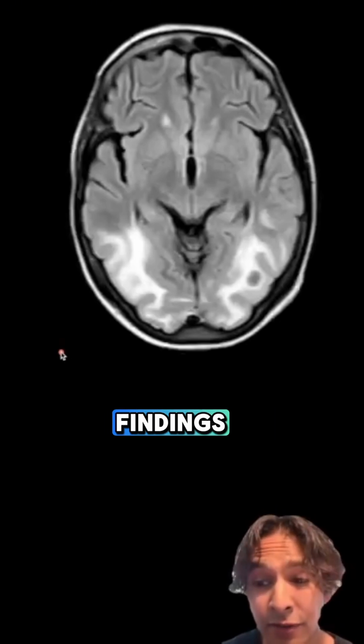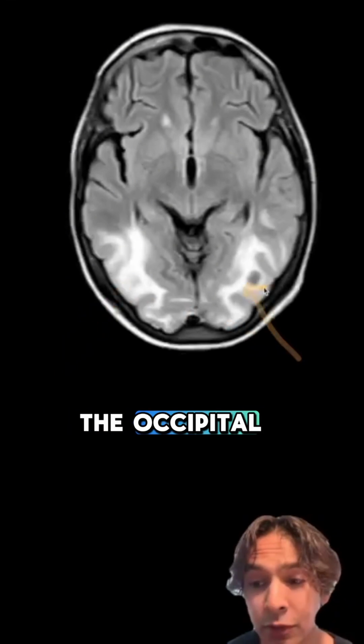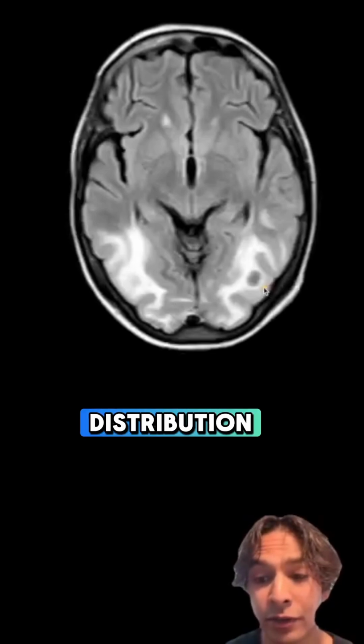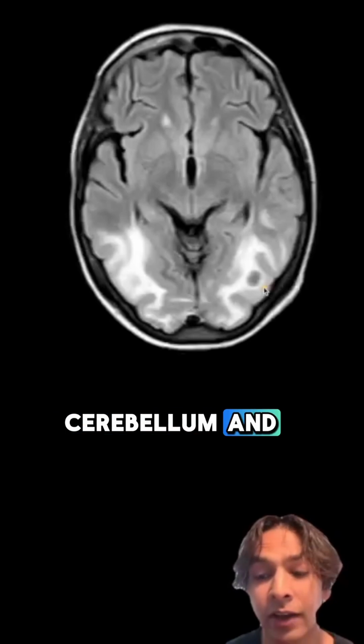In terms of imaging findings, you get this bilateral symmetric vasogenic edema in the occipital and parietal regions in about 70 to 90% of cases. But the name is a bit of a misnomer, and it can be found in non-posterior distribution, mainly in watershed areas, including the frontal, inferior temporal, cerebellar, and brainstem regions.